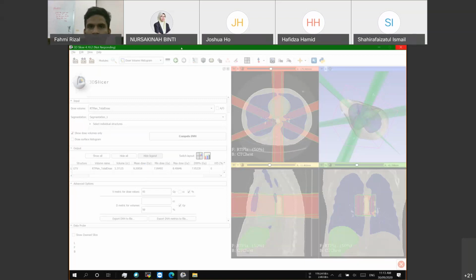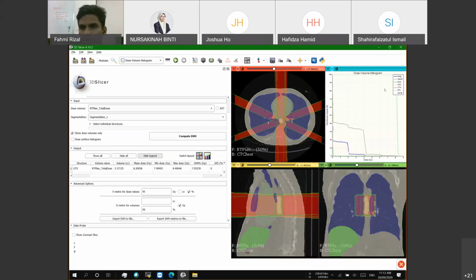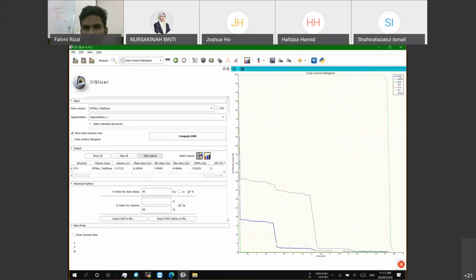So this is the DVH. You can click here to show all the graphs of the DVH only.